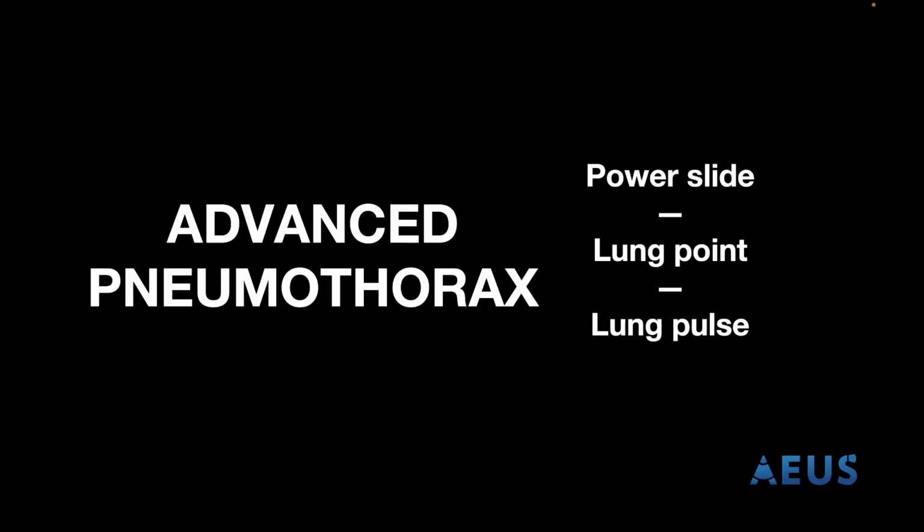Now that we have gone over the basic anatomy of our thoracic ultrasound, let's jump right into advanced pneumothorax evaluation. A basic evaluation for pneumothorax involves visualizing the absence of pleural sliding, indicating the separation of visceral and parietal pleural layers by air. If you visualize this, other adjuncts, such as M-mode or more advanced evaluations, are not necessary. However, when evaluation is equivocal for pneumothorax and you are clinically concerned, there are some other tools at your disposal that we will review here.